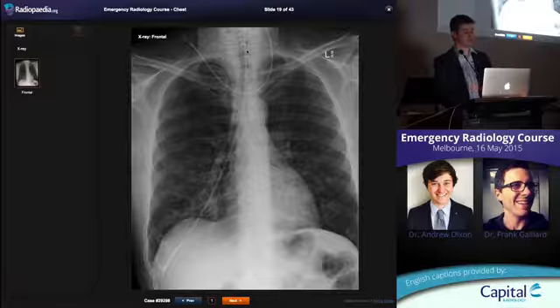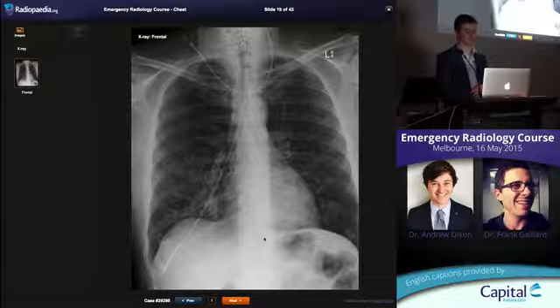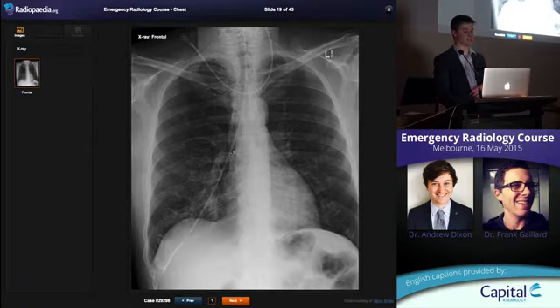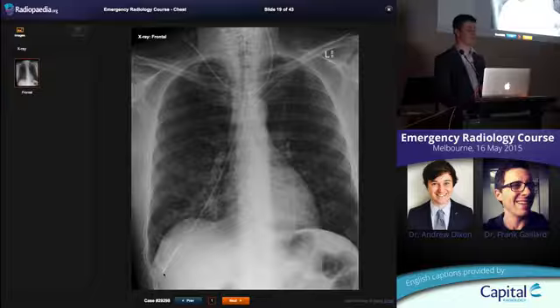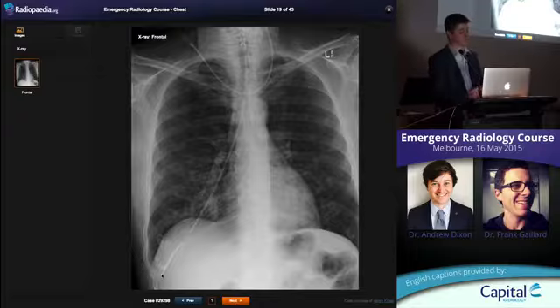So this case, the nasogastric tube, when you're looking at that, it should follow the mediastinum and head down through the diaphragm here into the stomach. If it's following the contour of the trachea down the bronchus, then you're in trouble, okay? And I just want to emphasise how far down that costophrenic recess goes at the back. This is still within the lung. It may be getting out towards the very periphery of the lung out there.